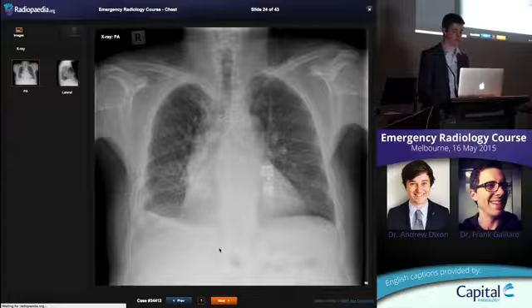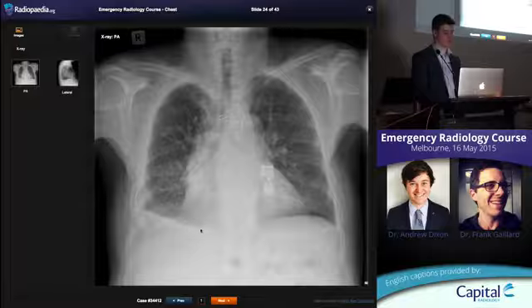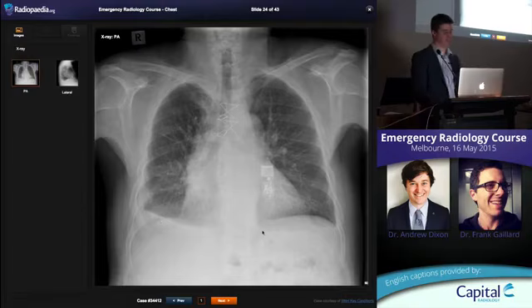This is another example of pleural effusion. This one's slightly different in that it doesn't have that nice meniscus, and the diaphragm looks like it's in a good spot here and then it moves up, okay? One of the things that I think Nina taught me very first was that the diaphragm should have its peak towards the mid-chest, the mid-clavicular line, and then it should descend back down again.